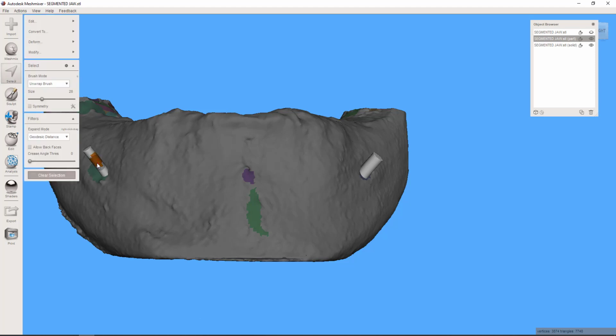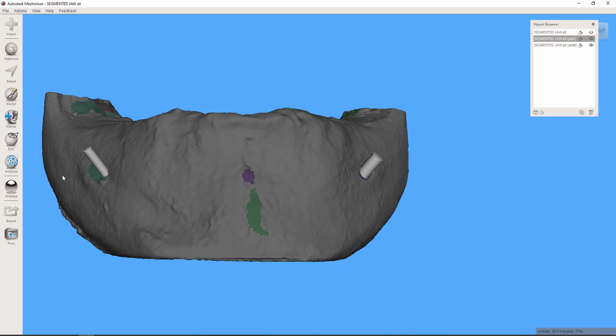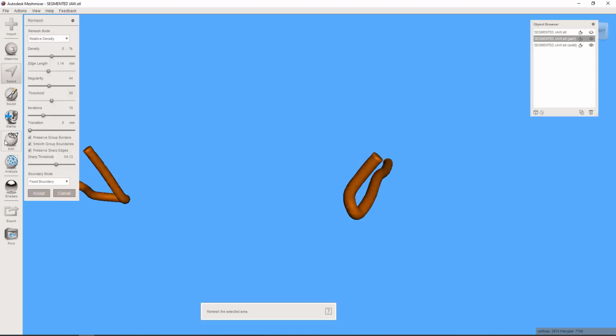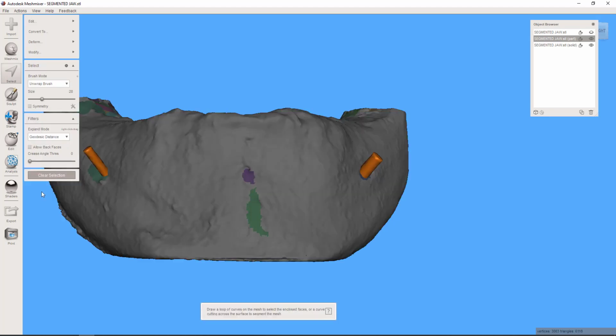This is a bit abstract, but these nerves a lot of times have a geometry that the software doesn't like when it's doing Boolean subtractions and things. Just take my word for it. Control A, select all of those nerve surfaces and hit R for remesh. And basically that's just going to analyze the mesh and make it evenly sized triangles throughout.